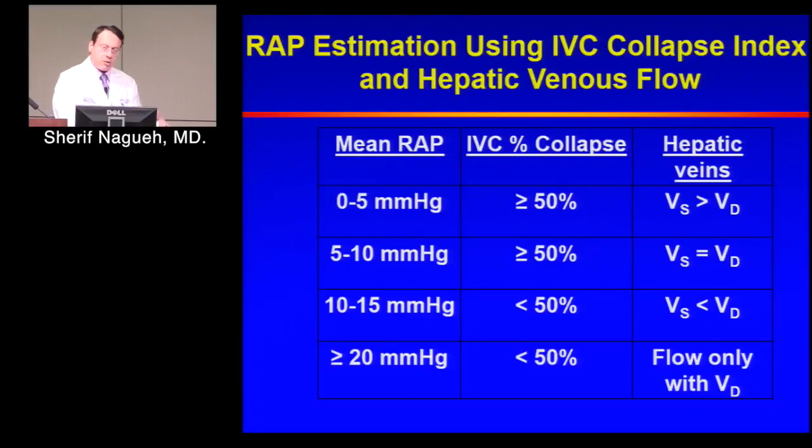You do not need to go exactly the way I have shown it, but what you want to do is put things together and look at what signals you have, technically, which ones you trust, which ones you don't, and what the physiologic situation is, so you can determine, if there is a discrepancy, where you put your trust.